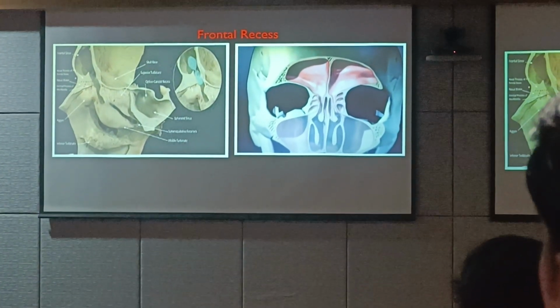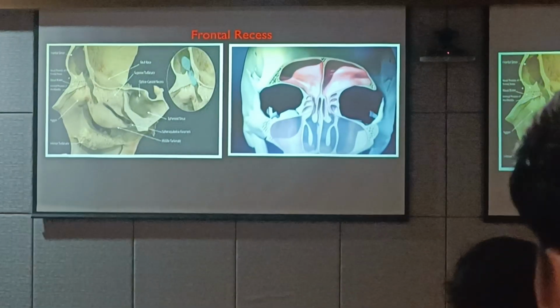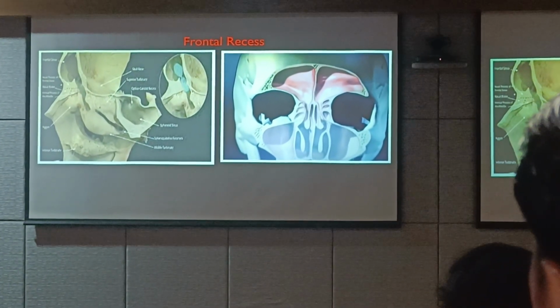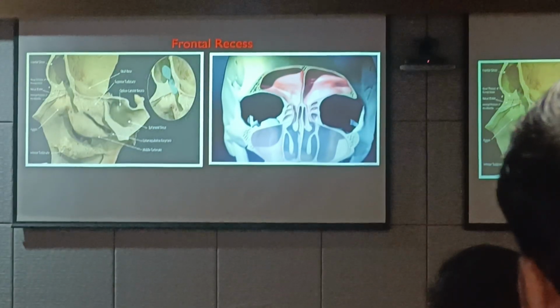You'll sometimes see us curating from back forwards, from the skull base. Take your instrument, curate, and come forwards. That's when your cells are more anteriorly placed. If your cells are more posteriorly placed, start from the front, go towards the frontal recess and draw them back. So that's how you uncap the egg, either front to back or back to front.